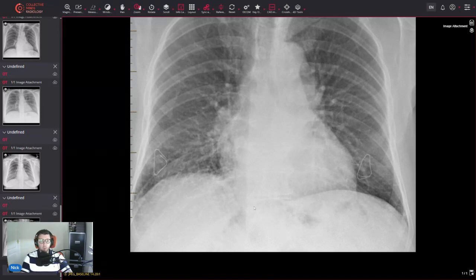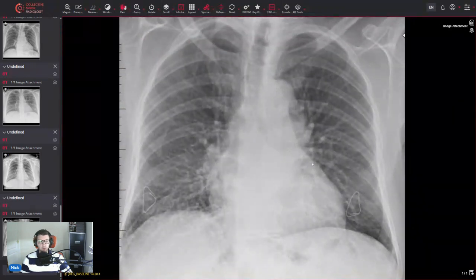If there is any doubt, you could do an AP and a PA with nipple markers. If you do it on expiration, the worry is that the hemidiaphragms may come up and obscure it. So the general consensus is to do an AP and PA rather than inspiration and expiration. Again, if there's still doubt, you can do CT imaging to make absolutely certain. It's better to be certain than uncertain and just leave it, and then they come back with an enlarged mass.